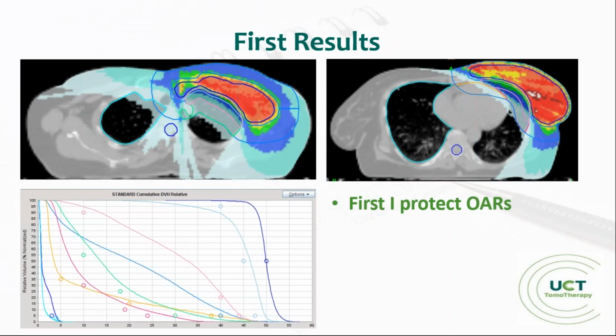Yeah. Because the normalization is performed using your DVH. So if I would start to do this from this point without creating the steep dose, then it would move the histogram from here to here, and we would have such a long tail, and all my optimization, all what I did, it would break it. So it would have to start from the beginning.